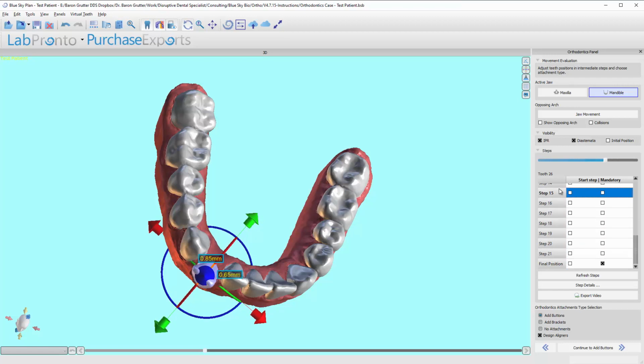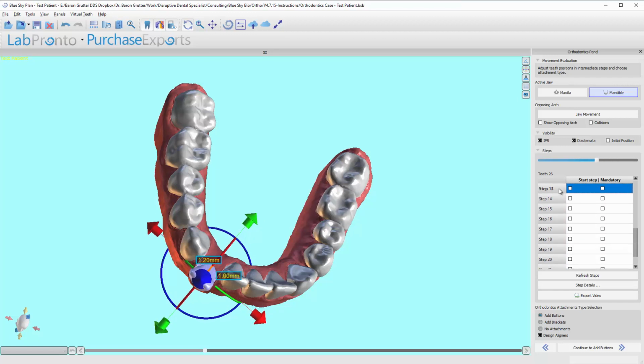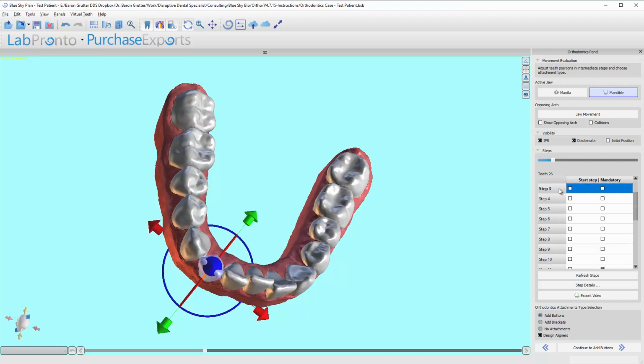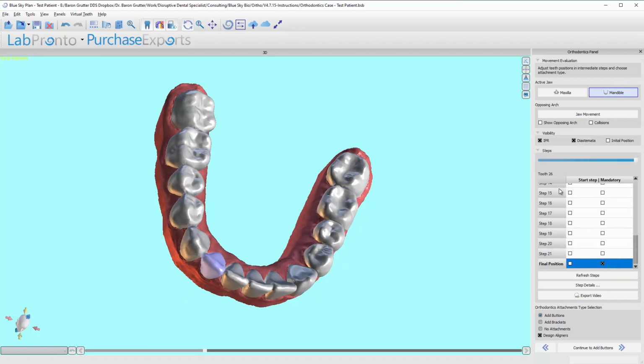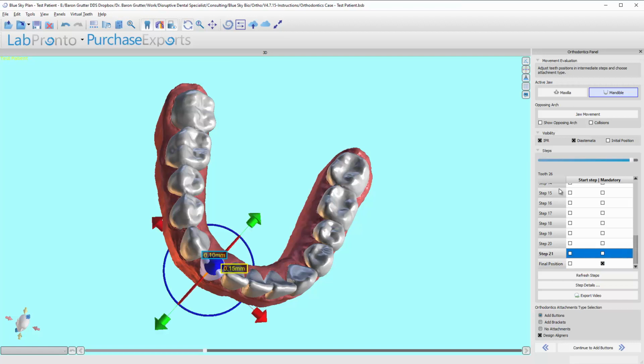You are round tripping. You're basically taking an extra destination along your way. That is sometimes needed to avoid collisions, to a much, much smaller degree. But now you understand how you can do that.